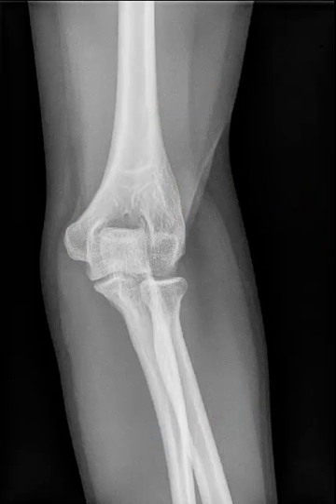Now let's continue on with the anatomy. Here, this lucent region on the humerus is the olecranon fossa. This will receive the olecranon process. This is actually a posterior structure. Now, here is the articular surface or condyle that articulates with the olecranon, which makes this the trochlea. Here is the other condyle, which articulates with the radius. This is the capitulum. Here is the radial head.